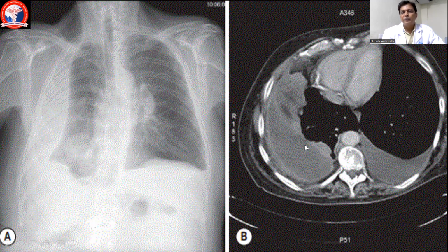So what does it indicate? This pleural change could be secondary to empyema. This is the infected area on the right side. On the left side, without any infection, it is just an effusion. So one more finding, which I would like to add now. We can see here the parietal pleura and ribs, and in between that, the space has increased because of edema and inflammation. And the fat is getting involved and it is showing an increase in the space.